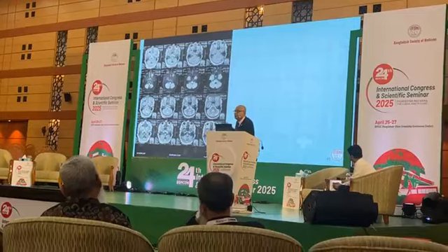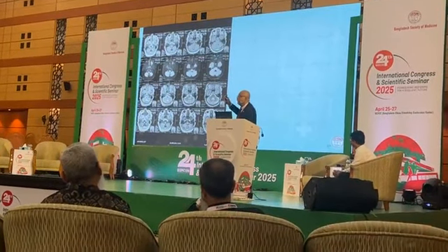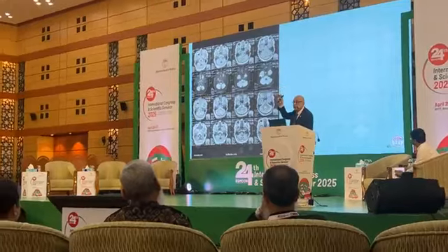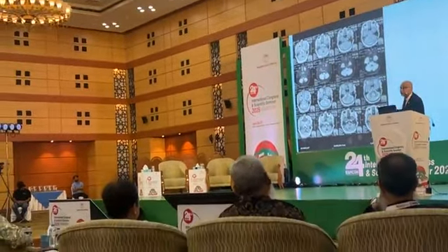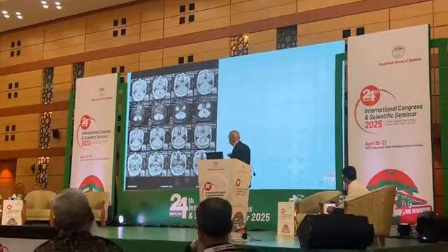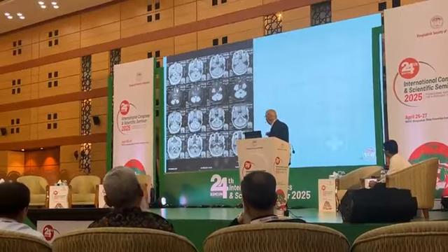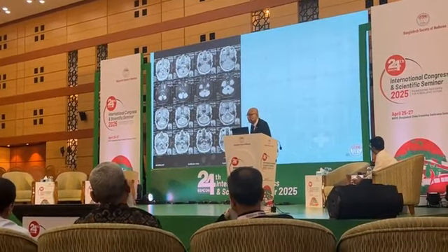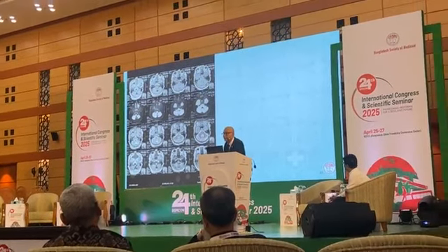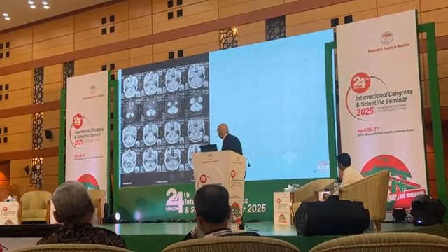Yes. It's small. It's difficult to see from behind, and with all these lights, if the lights were off, we could see them better. So there is a small lesion in the right side of the medulla that will give rise to clinical condition called lateral medullary syndrome with everything you know.